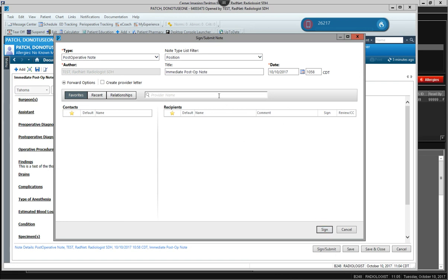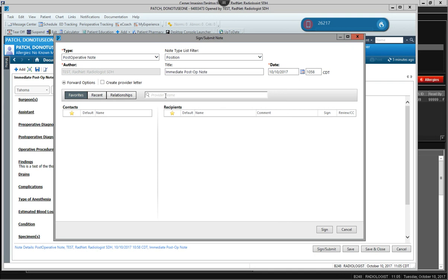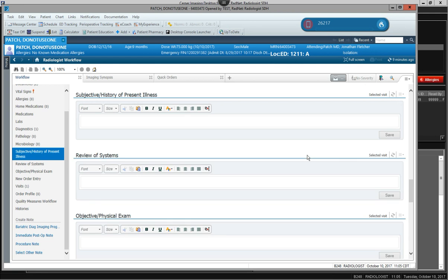This page basically gives you the option to carbon copy it to another physician if you want it to end up in their message center. If I'd have typed fast enough, I would have actually gotten my name. I can even put a comment here if I do that. And that's completely optional. That process is how nurse practitioners can send documents to you as well.